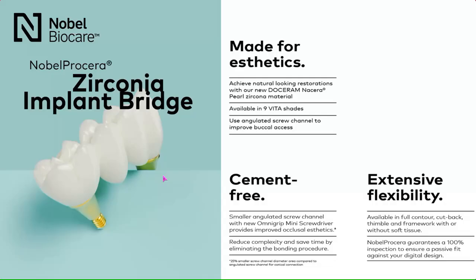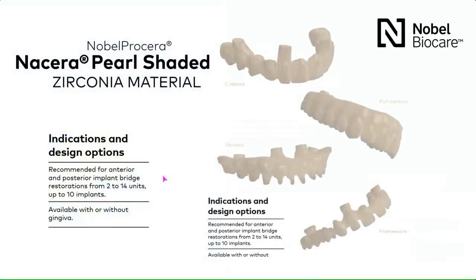Again, cement free. This is going to be with adapters that are screwed directly in to the zirconia. And there's a lot of flexibility in the design of the NobelProcera implant bridge. So we can support from 2-unit splint all the way up to 14 units and a full arch and up to 10 implants as well. So a lot of flexibility, a lot of freedom there as well.